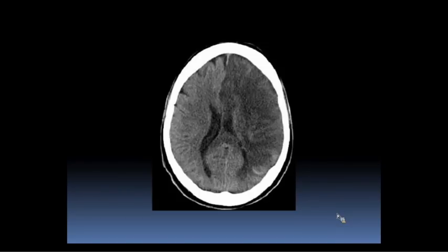Okay, and in this case, this is another one where you have probably an ICA occlusion, right? Because you have anterior cerebral artery and middle cerebral artery involved here. But in this case, we also have some little streaky densities here, over here, here. So this is probably developing a little bit of petechial hemorrhage. And so this is also a kind of a complication that can happen in the subacute phase.